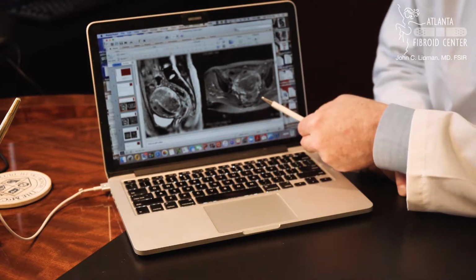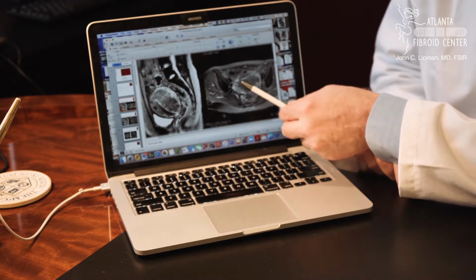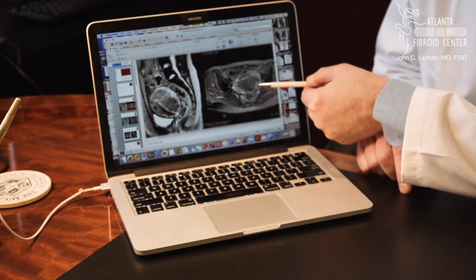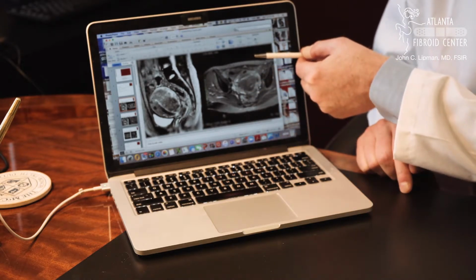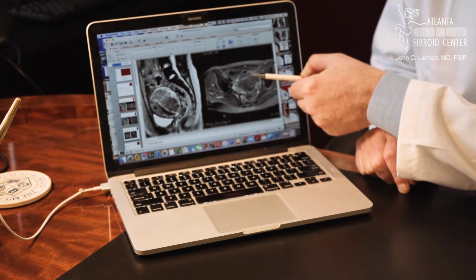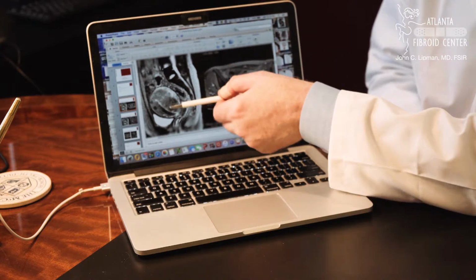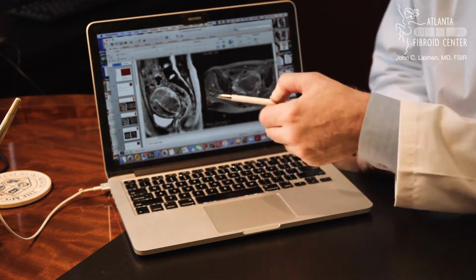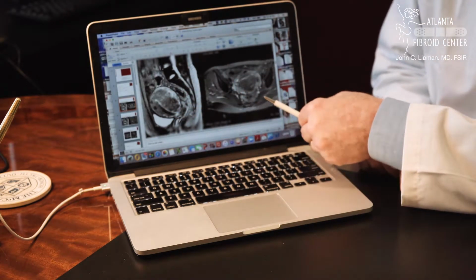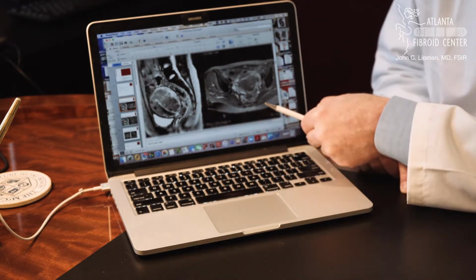This is the cross-sectional picture, again, showing the cavity as a white line. And you can see this really thick, dark area behind the cavity. The front of her is at the top of the image, and the back of her is at the bottom of the image. So again, very thick area behind the cavity, just as I showed from the side view, very thick area behind and also thick in front. And that's what it looks like on the representative MRI images.